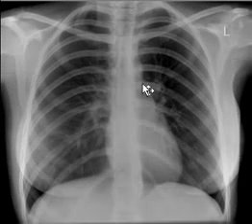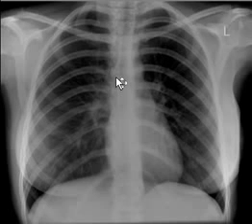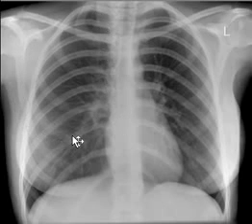So the trachea is central in this example, but grayscales are, however, not symmetrical over both lungs. The left lung looks a bit darker in the upper zone as compared to the right lung. However, in this particular patient, this does not represent any pathology because the patient is slightly rotated towards the left side.